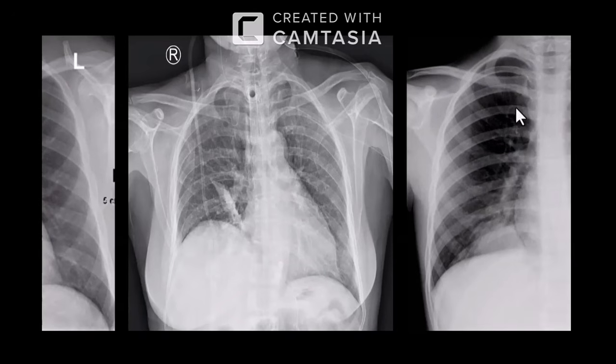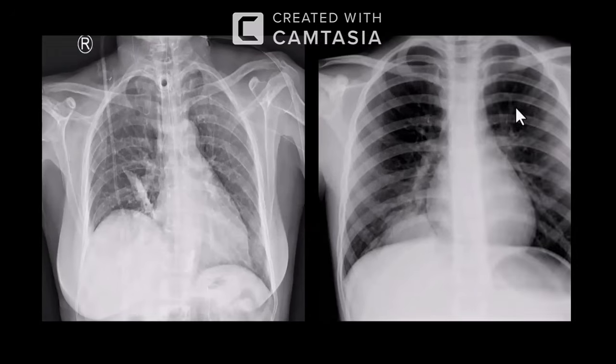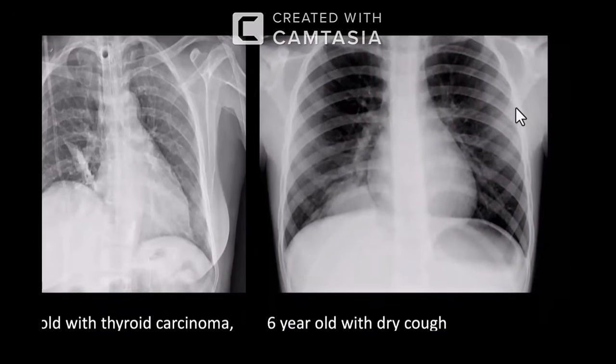And I can see some postoperative changes in the visualized cervical neck. Okay. How about this case?